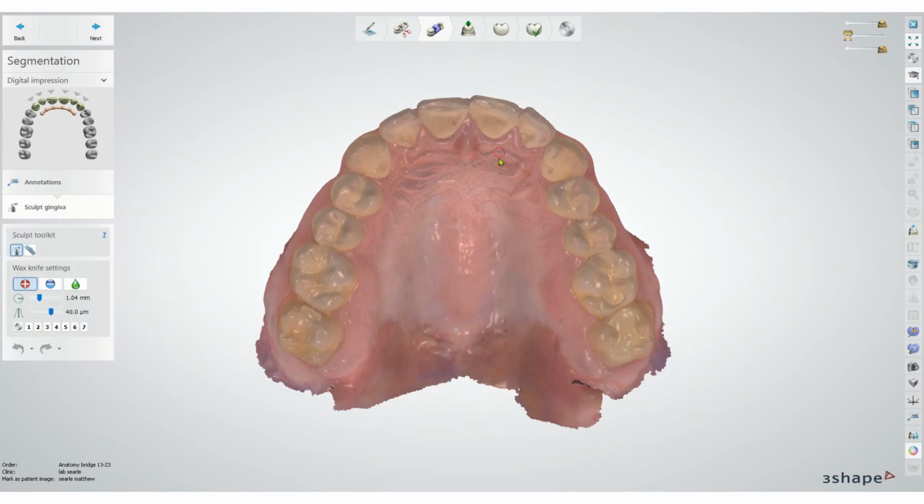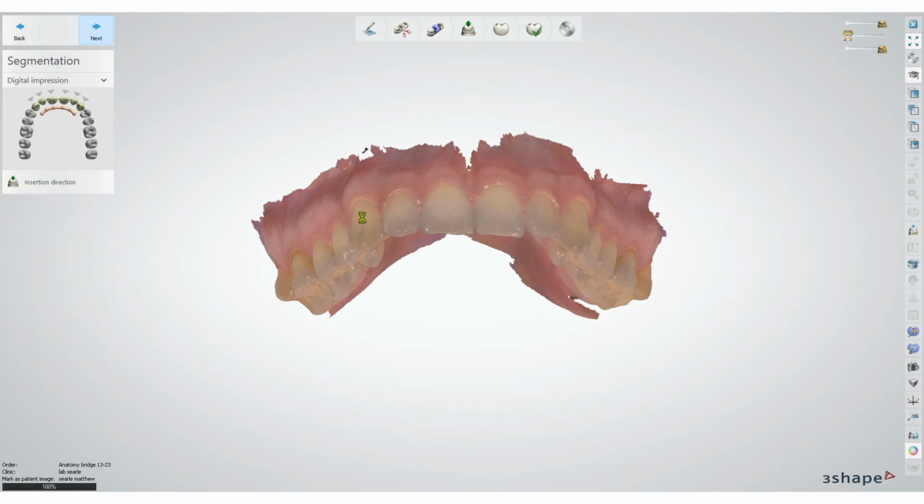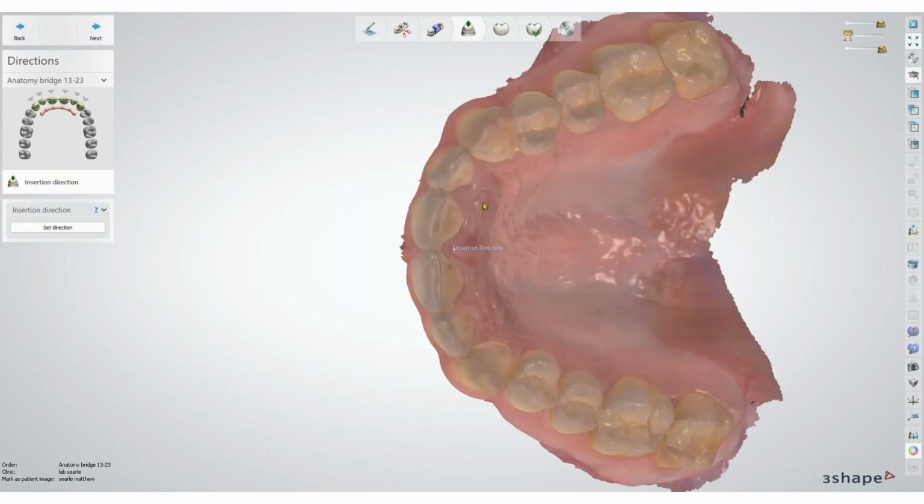I've set the annotations here. They were set 1, 2, 3, 4, 5, 6 where they needed to be. Next. Path of insertion, we just have to set the one because I bridged it, so that's the path of insertion set. And we're going to go next.